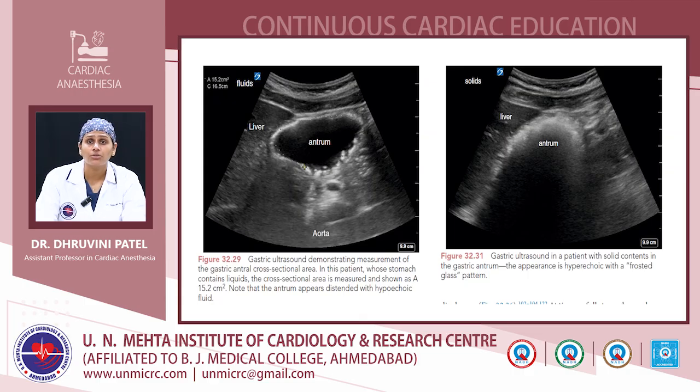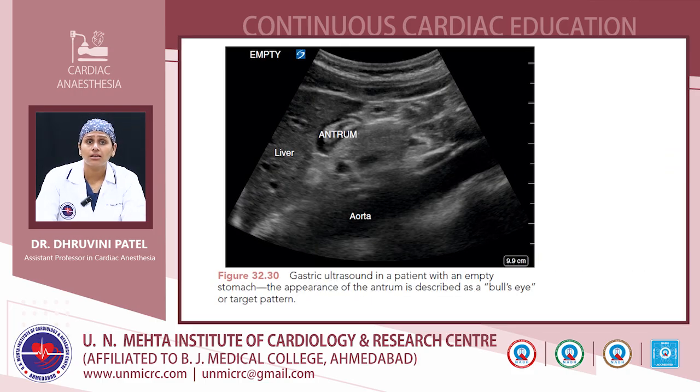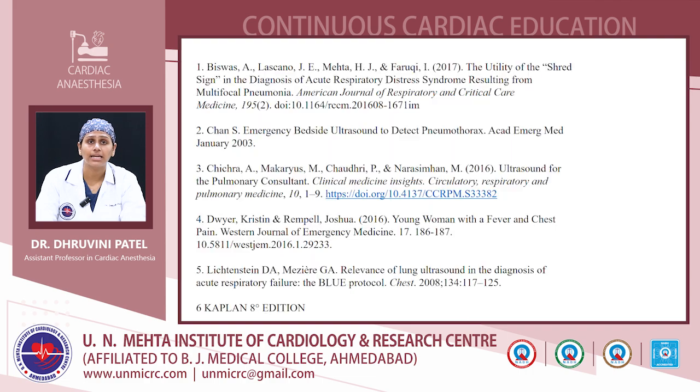If the gastric ultrasound is in a patient with solid content, the gastric antrum contains the solid, and its appearance is hyperechoic with a frosted glass pattern. This figure shows gastric ultrasound in a patient with an empty stomach. The appearance of the antrum is described as the bull's eye target pattern. These are the references. Thank you.